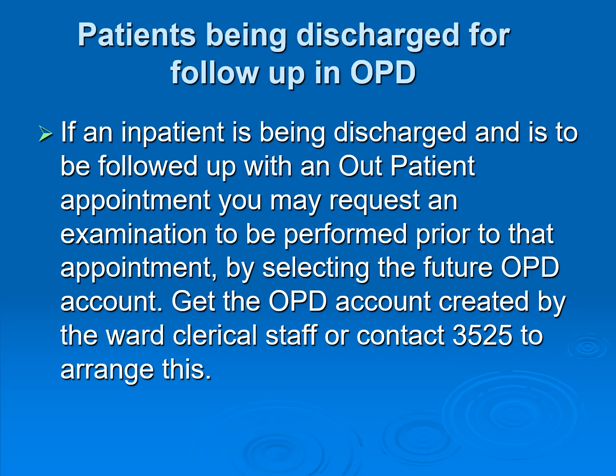If an inpatient is being discharged and is to be followed up with an outpatient appointment, you may request an examination to be performed prior to that appointment by selecting the future outpatient account. Get the outpatient account created by the ward clerical staff or contact 3525 to arrange this. An example of this is where a patient is being discharged with antibiotic treatment for a chest infection and your consultant requires an interval follow-up chest x-ray in 3 weeks prior to the outpatient appointment in 6 weeks.